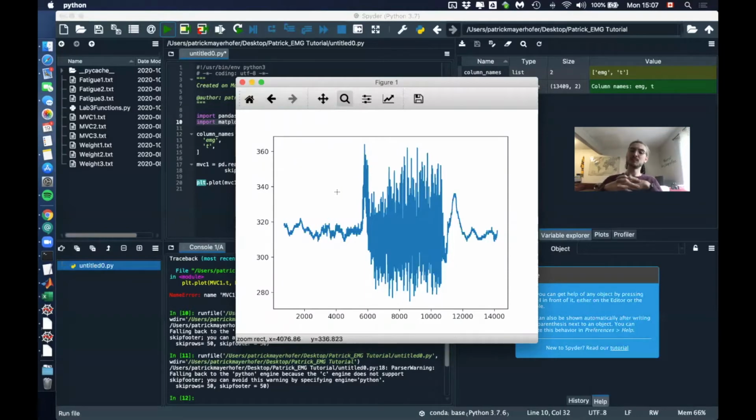It works well, but one of the limitations here is that the resolution is not very high because the difference in voltage is very small. Even though we could measure from 0 to 5 volt, it's just measuring somewhere between, I can't remember exactly, 1.6 and 1.7 volts or so. So then the resolution gets really, really low.